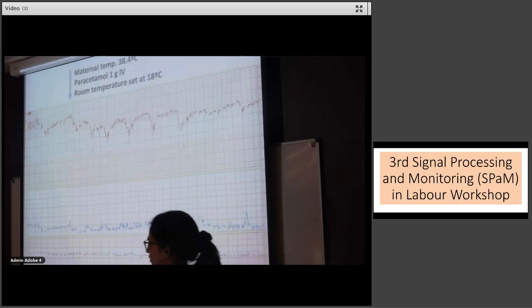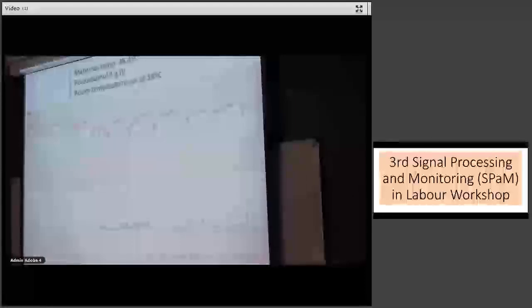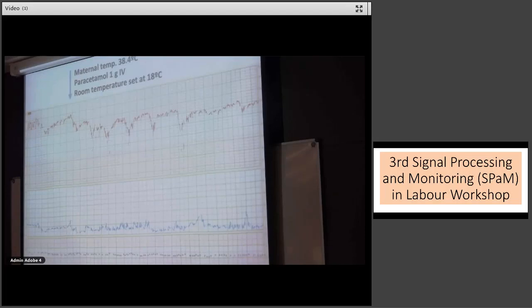Okay, Barry. The only point I want to make is that the baby is clearly recovering from an event that we don't see. That original tachycardia, you can make a story, but it was probably a deceleration from which the baby recovered, and would come down to what is reasonably its previously normal and stable baseline, and now with contractions. You can time the contractions simply from the timing of the individual decelerations. And notice that if you drew a line, this would be a stable heart rate, moderate variability, and intermittent decelerations. Pushing, probably not. Yes, probably not.